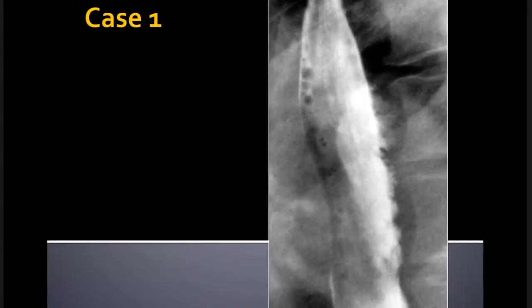Okay, so I'm provided with a spot image of barium swallow, lateral projection, and I can see a large radio opacity in the mid esophagus, which is eccentric and spanning a large course with the subtle haziness of the mucosa.